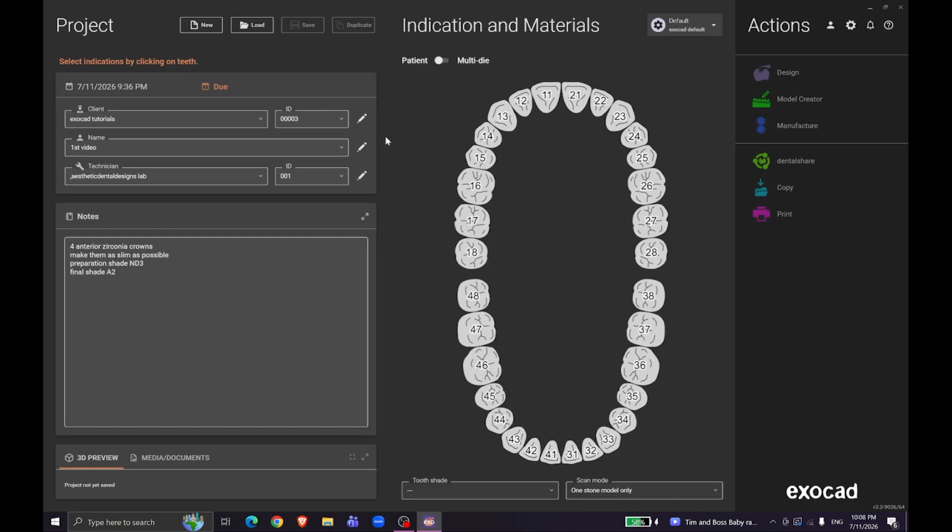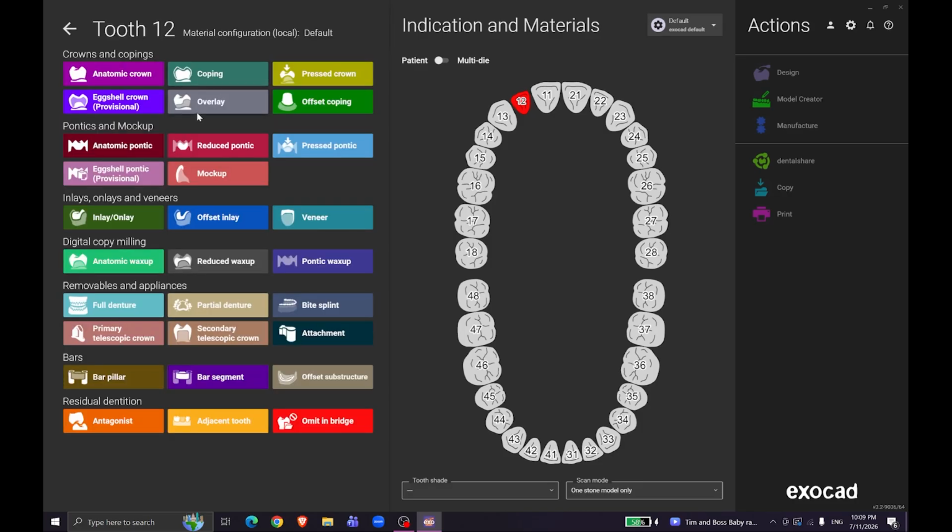indications right here. Down here, you're gonna find some 3D and not 3D previews. Actually, it's just gonna be a random picture from the case. The Exocad is gonna decide what to put there. Alright, if you have this here already, you can just click new. Since I already completed all those, I'm not gonna say new right now. I'm gonna continue with selecting the tip.